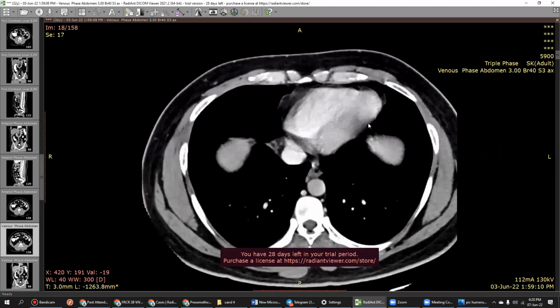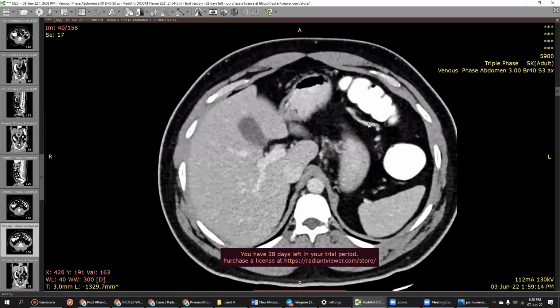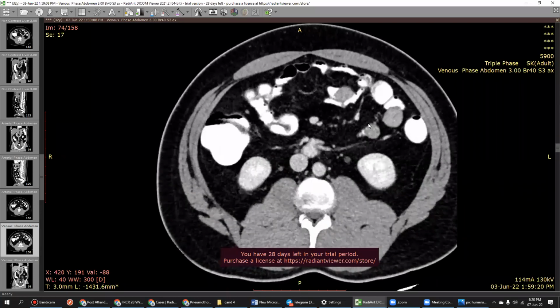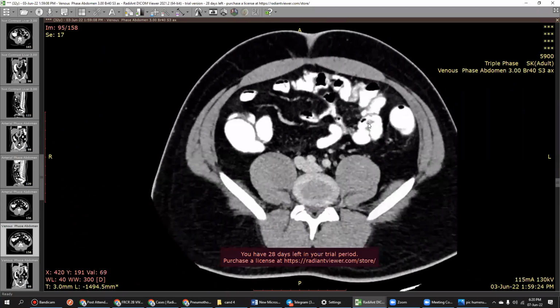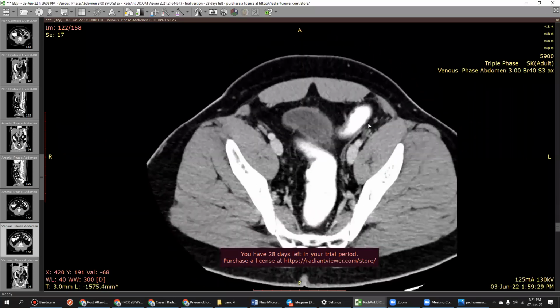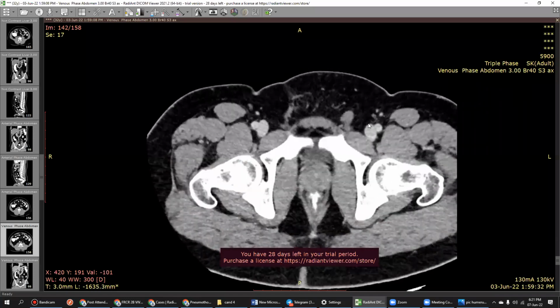I couldn't appreciate any other pathology in this exam except the left iliac fossa fat stranding with fat density noted inside. This is going with epiploic appendicitis. I would correlate with patient clinical history and inform the referring physician about that to start treatment, which depends on conservative treatment with non-steroidal anti-inflammatory drugs.